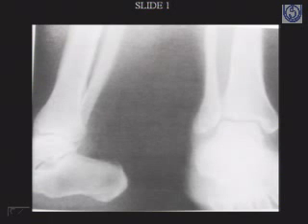Just a minute, sorry. Before you interpret, this skiagram is of the right leg, lateral view, and this is the left leg frontal view. This patient had pain and swelling in both the limbs. Alright. Continue.